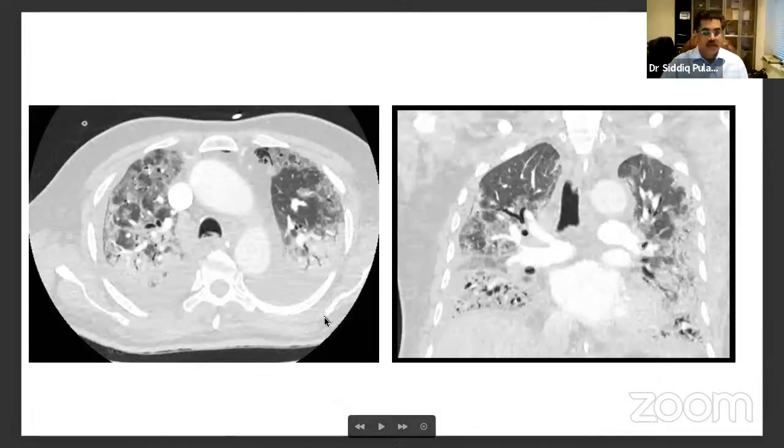Okay, thank you, Dr. Afsar, and it's an excellent description of the findings. Now, I think there are some questions about what happened to these X-rays or this patient later. I do a post-COVID clinic. What I've seen is just like a normal pneumonia. Most of the patients who come back after maybe 6 to 8 weeks of COVID, the X-rays are going back to normal, just like other pneumonia.